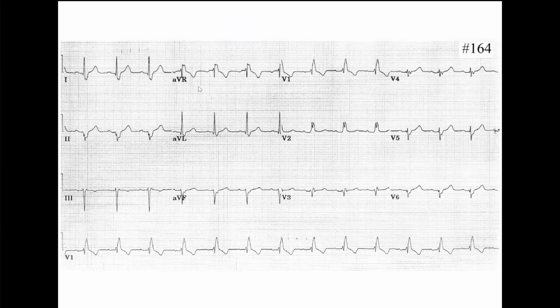All right. Then I move to V2, which we can see in V1 and V2. Don't jump, don't jump. First of all, you have to look at the P wave. Is it normal? I would say yes. Good. PR interval. Normal, good distance, 0.12 seconds. Okay, that's a little bit wider than 0.12 because from the beginning of the P till the beginning of the QRS. Yes. Okay.